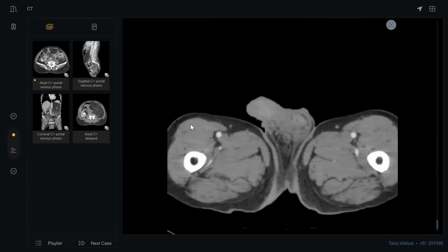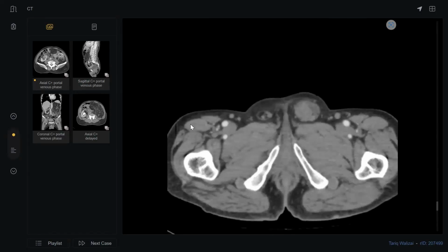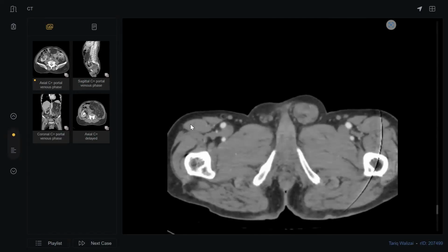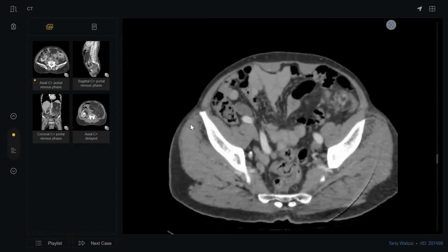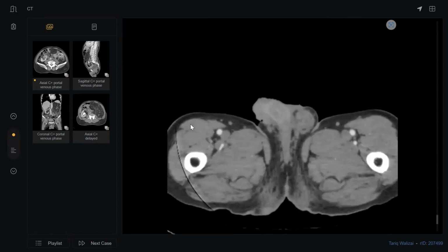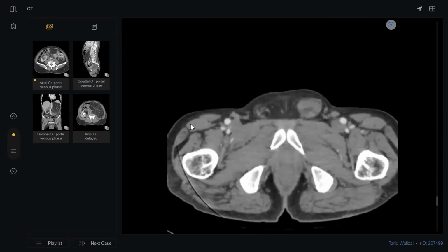You did very well, Dr. Roshni. This patient needs consultation, but you forgot something here: a left inguinal hernia. This is a case of satisfaction of search. Very important, despite this not being strangulated or complicated, it is important to mention because it is very clear.